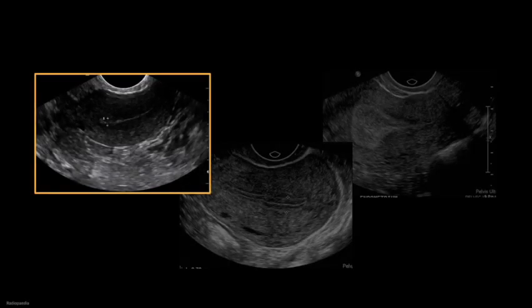These three images come from women at various points during her menstrual cycle. This picture was taken during the menstrual or early proliferative phase. We see a relatively hypoechoic uterine myometrium with a thin, brightly echogenic stripe. Occasionally during menses, a thin layer of fluid can be seen in the cavity if using a high-resolution transvaginal probe. So once again, we see this hypoechoic myometrium and a very thin but very bright endometrial stripe.